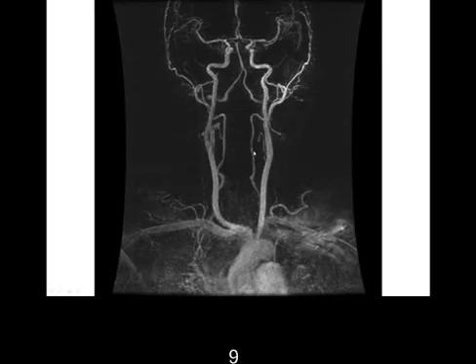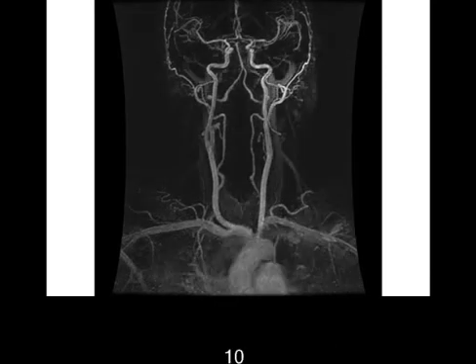And then the next picture is getting more blood contrast. By the way, this is not a traditional angiogram using iodine-based contrast. This is MRI contrast, which doesn't have much allergic reaction and is pretty safe. Of course, we have to check the patient's renal function. If the patient is in renal failure, with GFR less than 30, we cannot give it because of the nephrogenic systemic fibrosis risk, but most of the time we can give this, and then we see the arteries well, and then keep going.